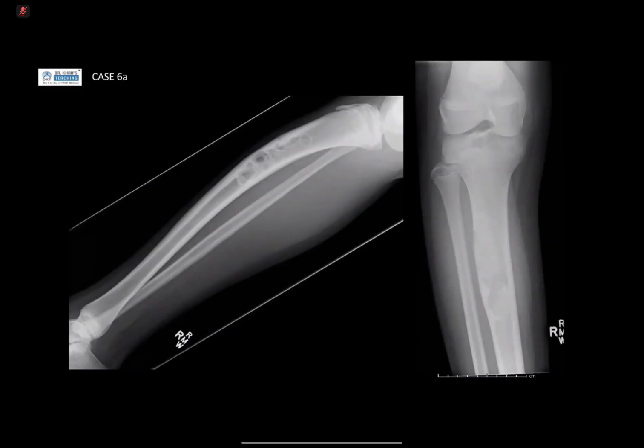So I was worried whether there's a fracture because of a torus or buckling sort of thing. Okay. Lucency. And also I can appreciate, maybe it is overcalling, in the distal tibial epiphysis, I could see a thin linear lucency. Okay. So we're thinking that the patient may have had a previous fracture.